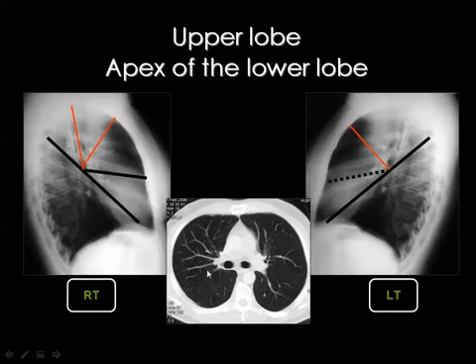Okay. Then you came to the tracheal bifurcation. And whenever the trachea bifurcates, then you get division of the section into two, like this. If you look here on the left side, this section is near to the hilum. What is remaining from the upper lobe? It is the anterior segment and the superior segment of the lower lobe. And here, the anterior segment of the upper lobe, because the apical and the posterior are not yet present, and you see the superior segment of the lower lobe.